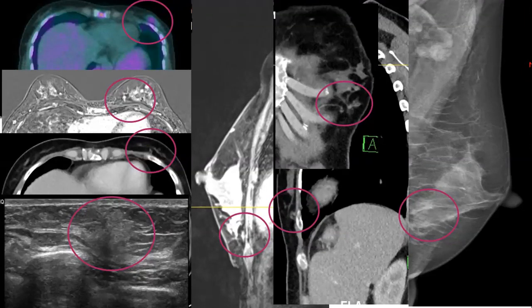Yes, focus. We have to consider the breast until it proves its innocence. I was saying until it proves its innocence. That is why we approached the case in that way. Fortunately, she's okay now, but look at breast cancer, sometimes how aggressive it is. A 1 centimeter, very tiny lesion giving extensive metastatic disease.